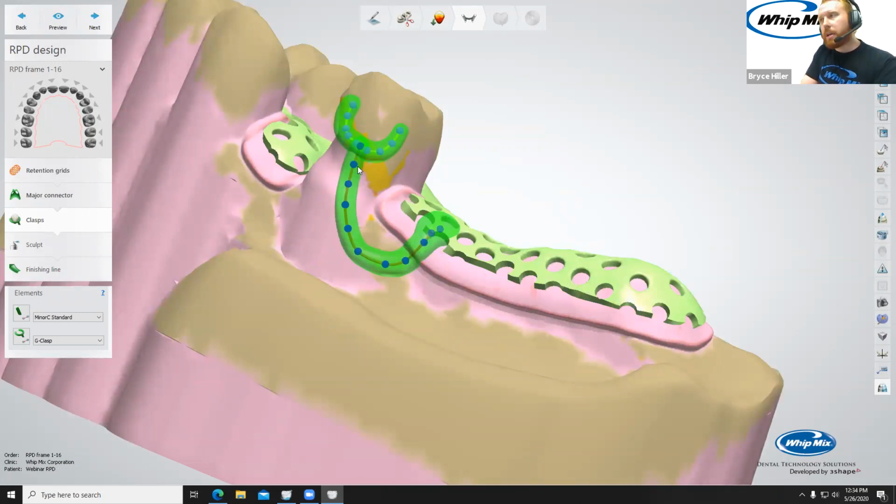You can completely design your own clasping profiles, your own wax profiles. You can come up with any shape you want, really. You can draw the 2D profile of it, which is really cool. You can choose if you want to taper one end or both ends and how much you want to taper them. If we have time at the end, we'll hop into the control panel and show that. Cool.